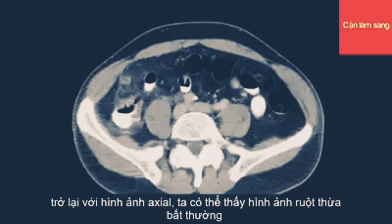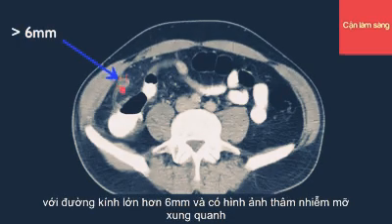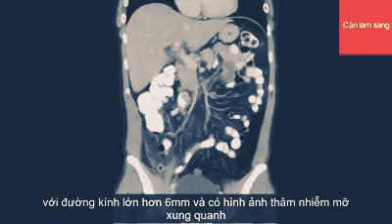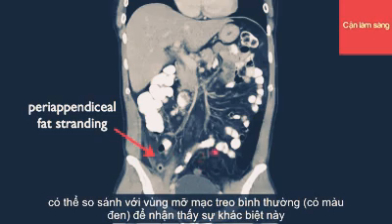When we switch to the axial plane, we can see that the appendix is abnormally distended, measuring greater than 6 millimeters in diameter. And the fat surrounding the appendix is abnormal. Instead of appearing nice and black, the fat is edematous and has turned grey, an appearance known as fat stranding. We can compare that to a region of normal intra-abdominal fat here, which has a nice black appearance.